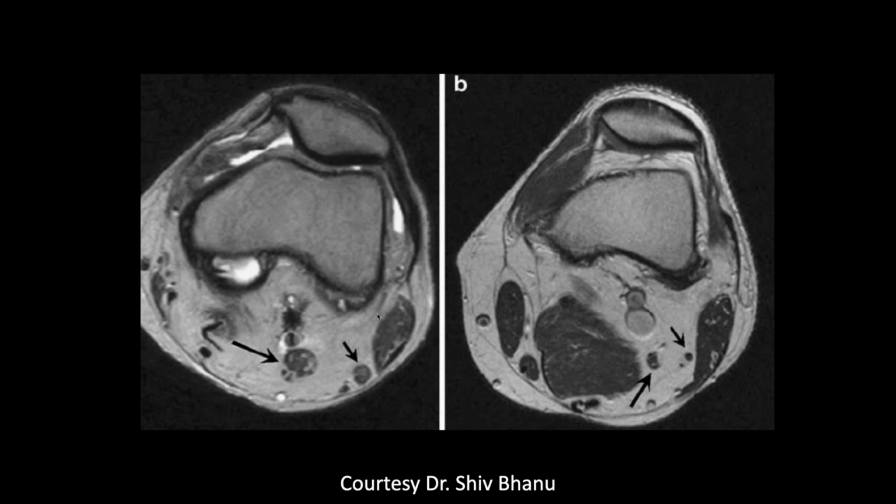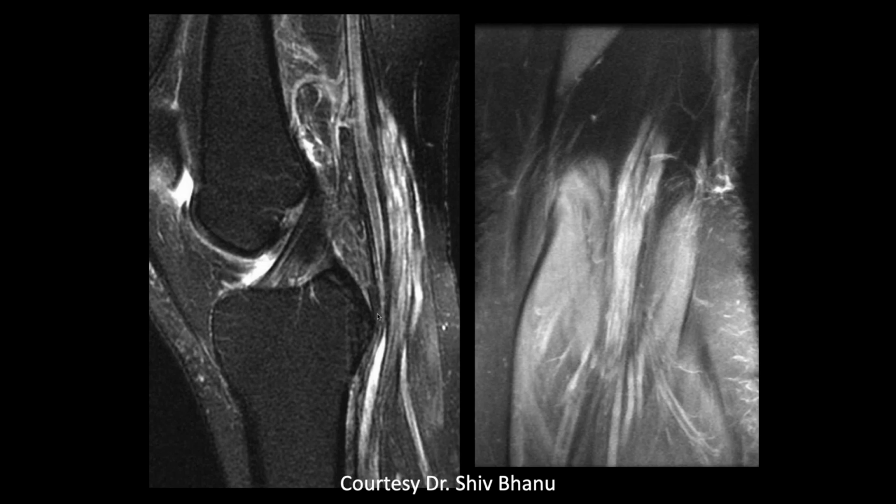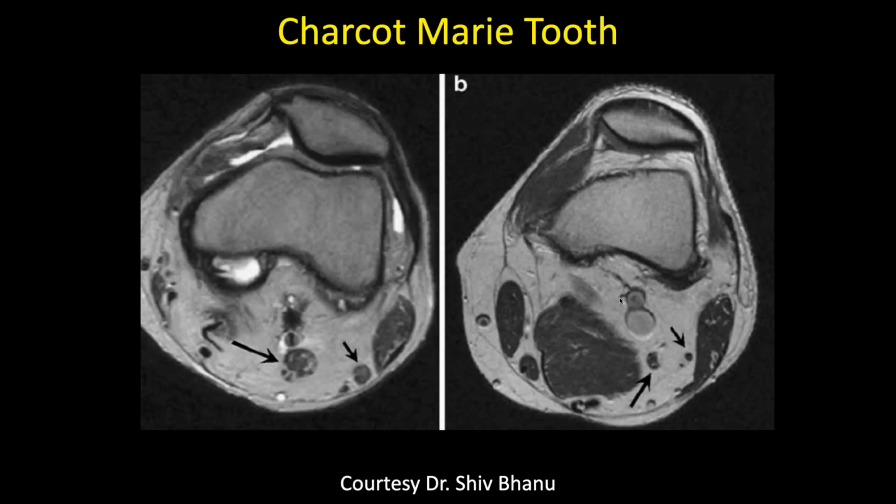So either some type of neurofibromatosis. But with neurofibromatosis, there should be more focal areas of nerve enlargement. This looks like it's really enlarged over a long distance, and it's relatively uniform in size until they start branching distally. And this is Charcot-Marie-Tooth syndrome. Charcot-Marie-Tooth syndrome actually is a cluster of a number of genetic abnormalities. It's not really a single genetic mutation. So it can present in varied ways depending upon the individual and which abnormal alleles the patient has.